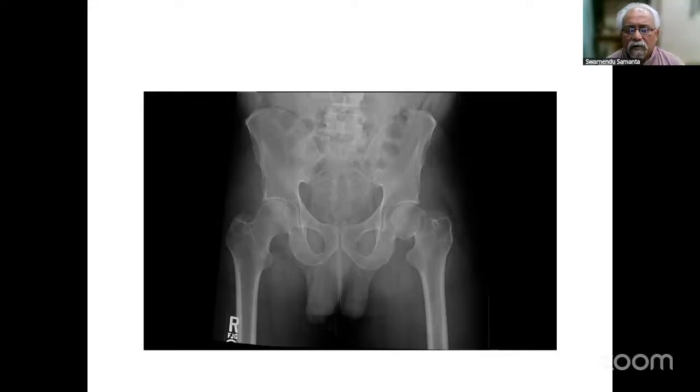Yes. You have rightly told that this is a radiograph of the pelvis. You don't have to mention the plane.